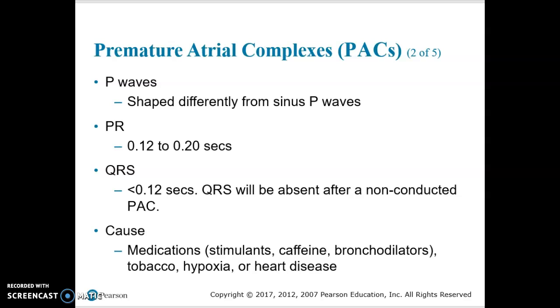You may not see a distinct P wave. It may be hiding in that T wave. But take a look, because if you see that P wave or that deformed T wave indicating a P wave is hiding in there, then that would tell you that it's a premature atrial complex. Then it would be a non-conducted premature atrial complex.